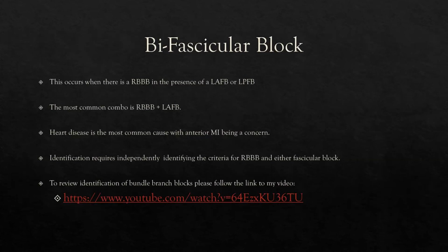Okay, and so that brings us to the next thing. Those are all the criteria for finding a single fascicular block, so either the anterior or posterior. Now what happens if you do have, like I showed you on that previous slide, a right bundle branch block with a hemiblock, either the left anterior or posterior fascicle? We term those bifascicular blocks. The most common you're going to run into is a right bundle branch block with a left anterior fascicular block. Both the right bundle and the left anterior fascicle are thin filaments. They're very easily diseased or compressed.